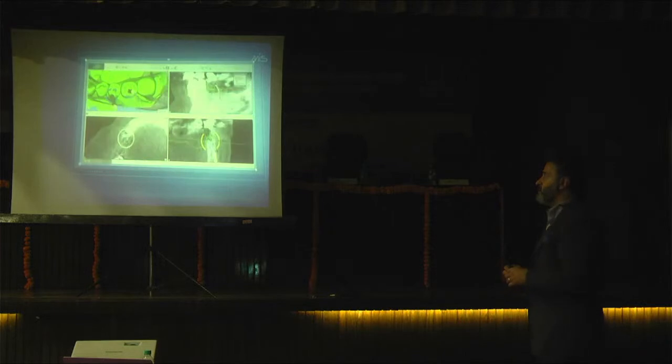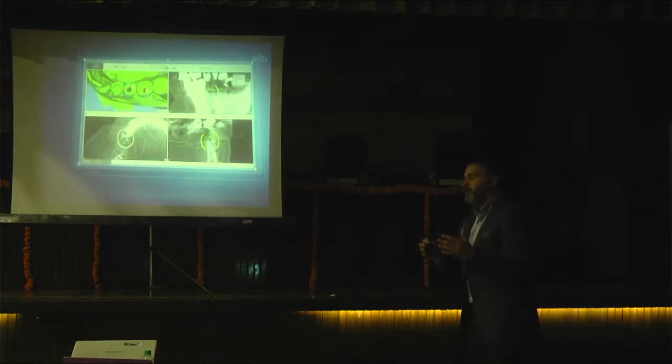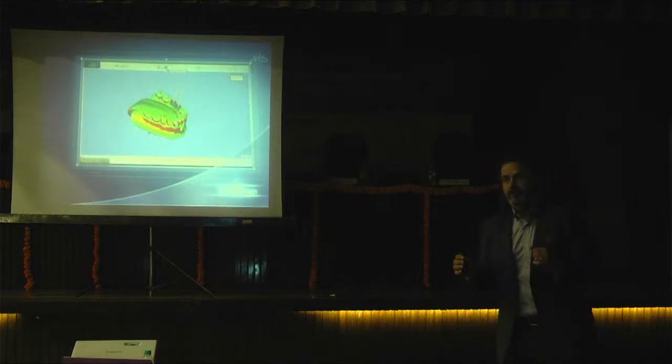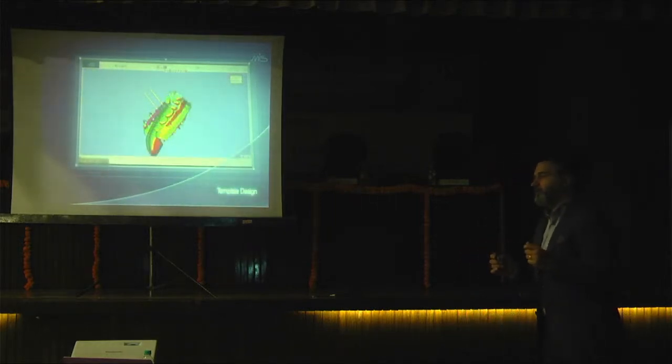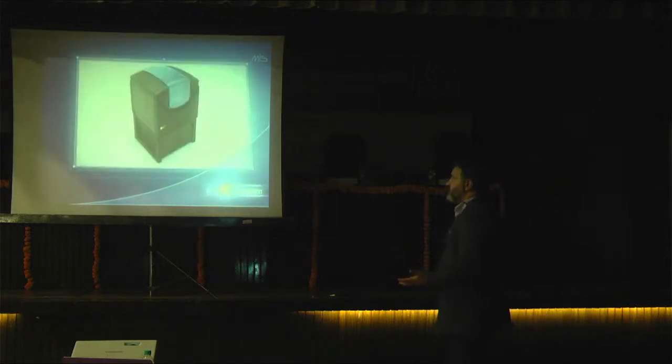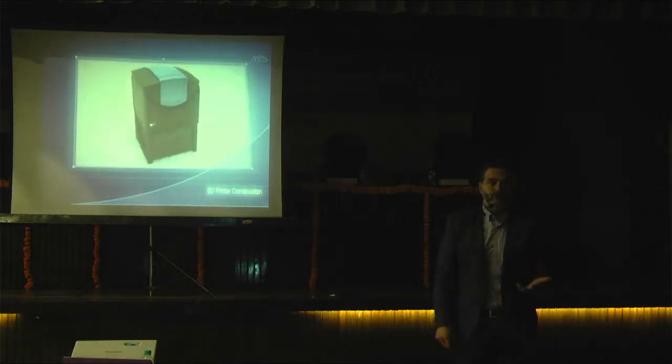With the implants, you have a limitless chance to touch the case. You can angulate the implant. You can make the implant go mesial a little bit. Maybe you can make it angulated. It depends on the prosthesis that you look for, that you want to do.